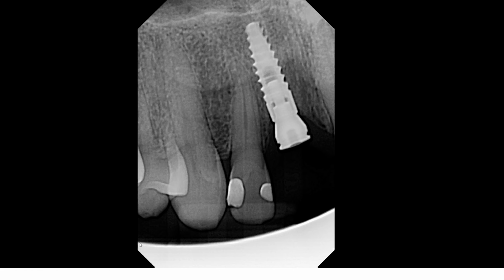That's my understanding. If you look at the border of this cone cut, we see that it's rounded rather than a straight line. That's how I know this clinic used a round collimator. And the fact that this area is radiopaque translates to the fact that this part of the sensor did not receive any photons or any X-ray radiation.